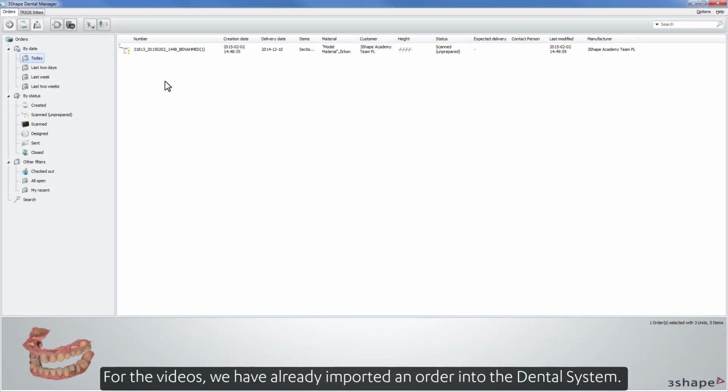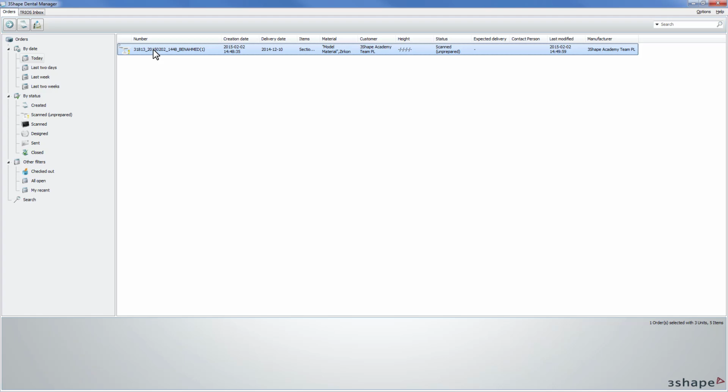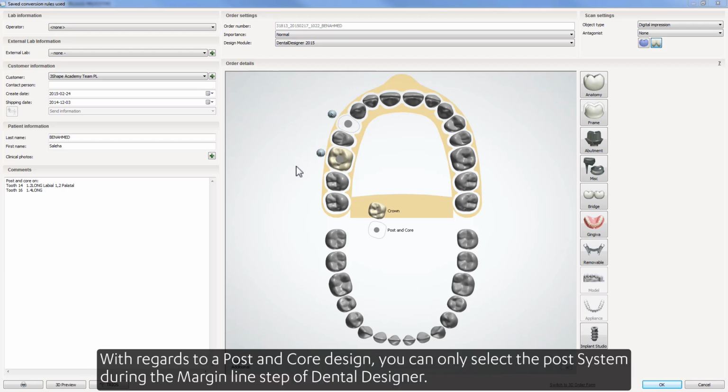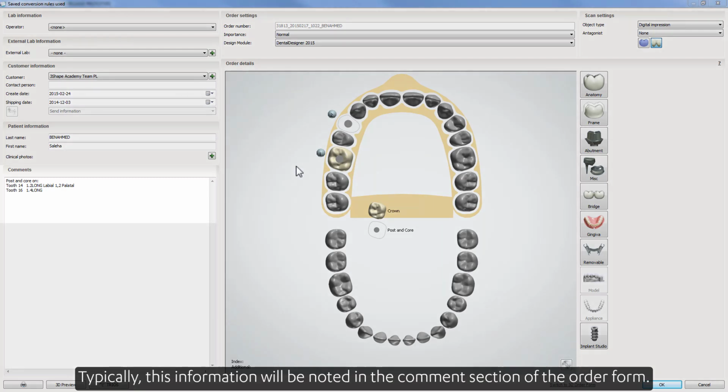For this video, we've already imported an order into Dental System. Before you start designing your case, we recommend to check the information on the order form. With regards to a post and core design, you can only select the post system during the margin line step of Dental Designer. Typically, this information will be noted in the comment section of the order form.